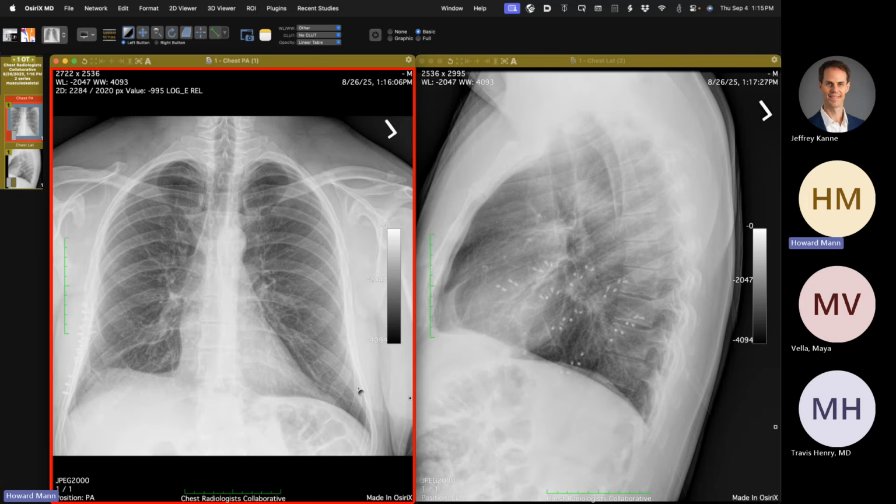It's just that's what they did. I'm not sure what holds everything together. Yeah, since they're constantly moving. Yeah, you just put little screws across fractures like that, some super glue, in pairs or something. So I don't know. Not likely to see this again. So just a curiosity. Okay, those are my cases.